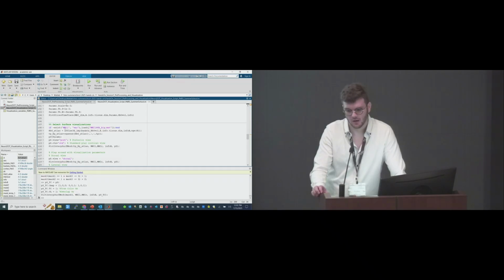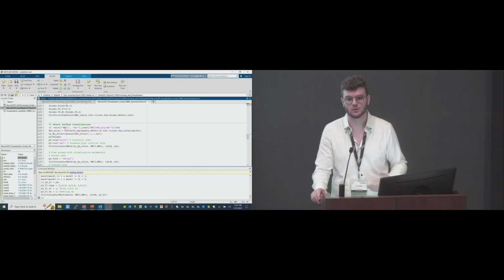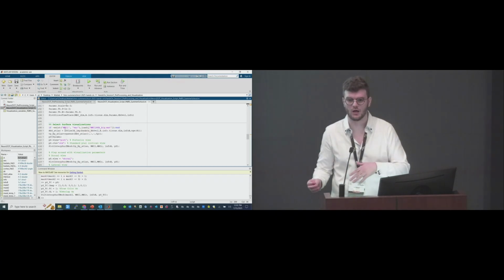Awesome. For that, you would be running a participant-specific light model. If you were to use our pipeline, we utilize FreeSurfer and FSL for that. From that pipeline, you would also have to create an affine matrix that goes from your participant space to your atlas space.